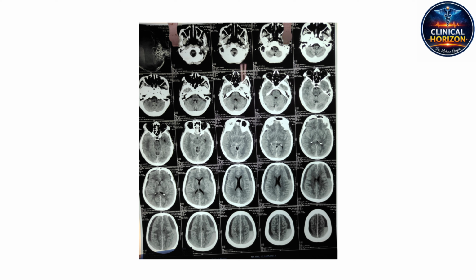And it bleeds slowly. The vein oozes slowly. Over weeks, the initial hemorrhage degrades and liquefies, turning dark and hypodense on the CT. That is the chronic component. But the danger isn't over. Not at all. The bridging veins remain vulnerable in this expanded space. A second minor bump causes a fresh hyperdense venous bleed into that old hypodense fluid cavity, giving us that mixed density on scan 6.